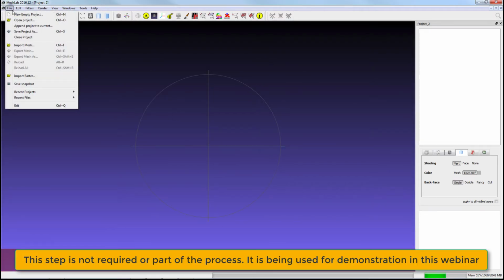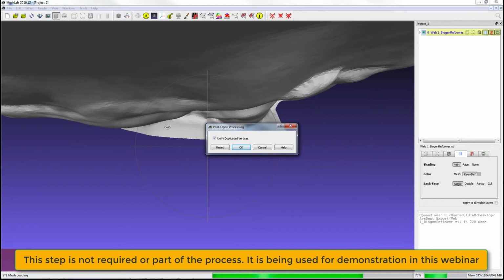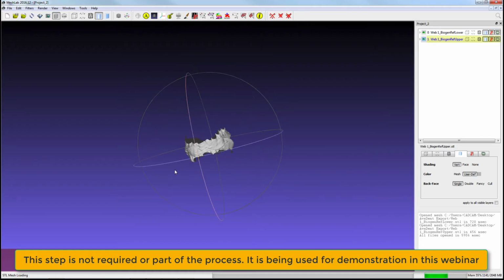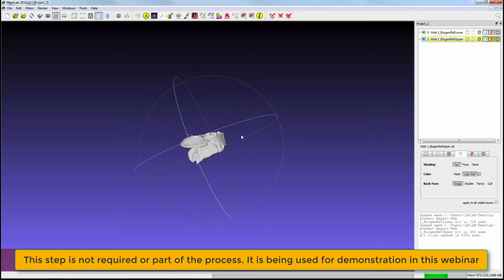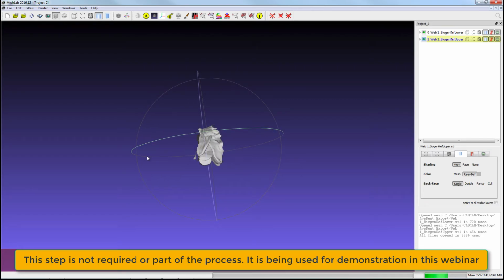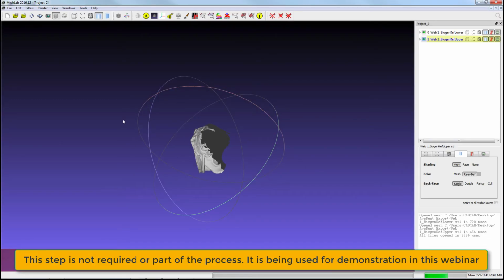If we were to import the biogeneric files, you see they won't articulate together because they were not stitched together using the buccal bite. So those files are the ones that AvaDent will take and stitch together for you. So don't worry about them not being together. Again, we're going to send 4 files to AvaDent.